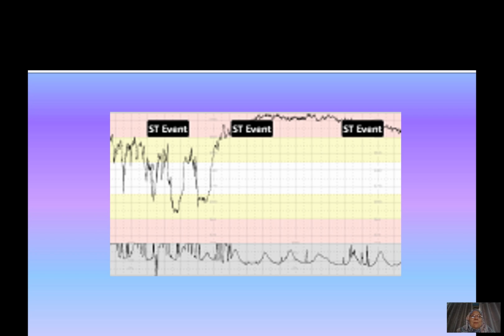So what is the normal number of contractions in 10 minutes? Yes, 4 to 5 contractions in 10 minutes is normal. So 6 contractions in 10 minutes seems a lot. Maybe this patient undergoes induction of labor, and this is a kind of hyperstimulation of the uterus. If we now look at the CTG, we can look at the baseline rate, and the baseline rate is around 160.